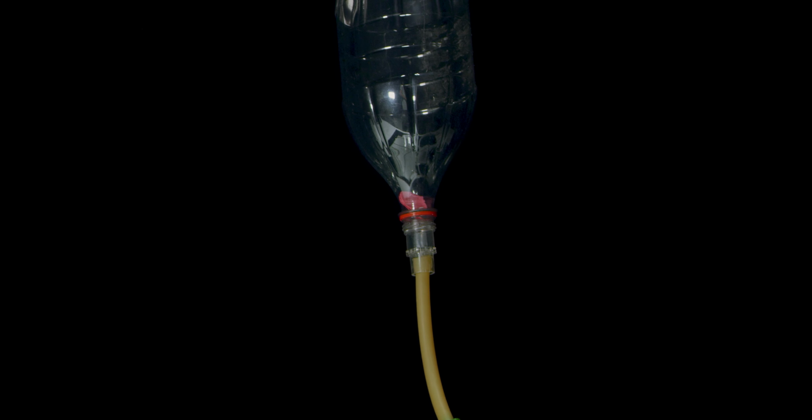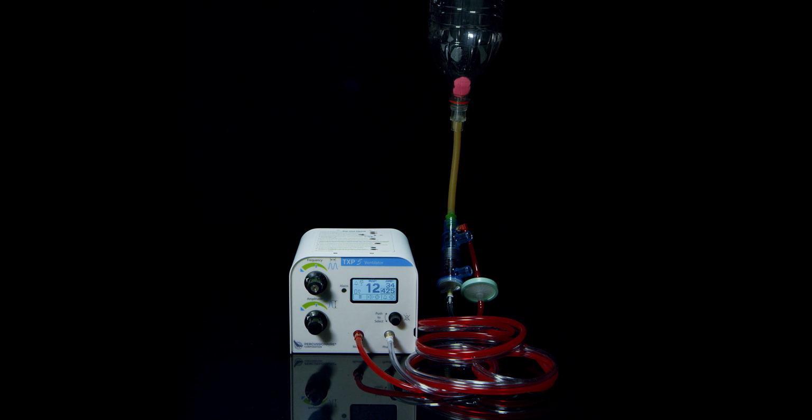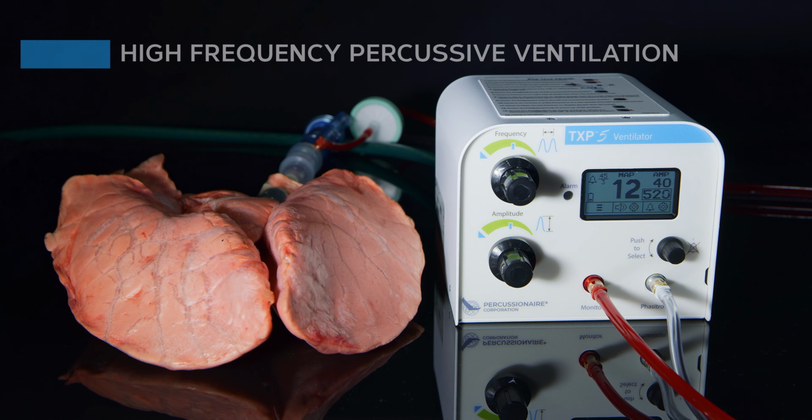The rigid container is then connected to the TXP5 high-frequency percussive ventilator. Immediately, the confetti circles around the container in a molecular dispersive manner of counter-current flow. This dispersion of gas molecules at the lowest level of the lung allows for optimal capillary gas exchange. Meanwhile, non-injurious mean airway pressure is held, no matter what the size of the lung is.